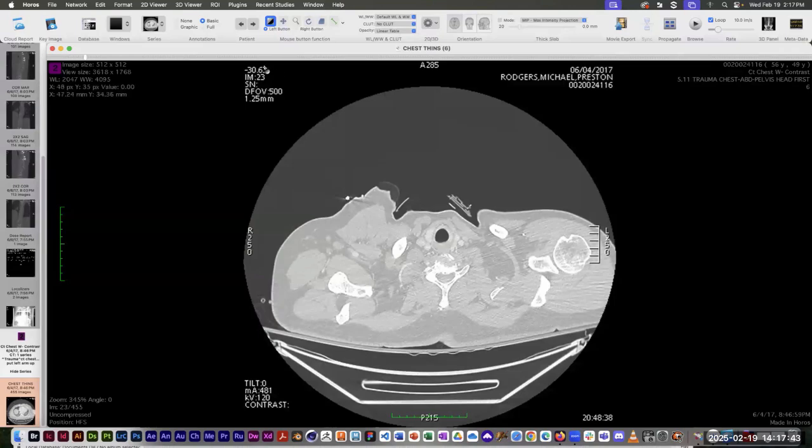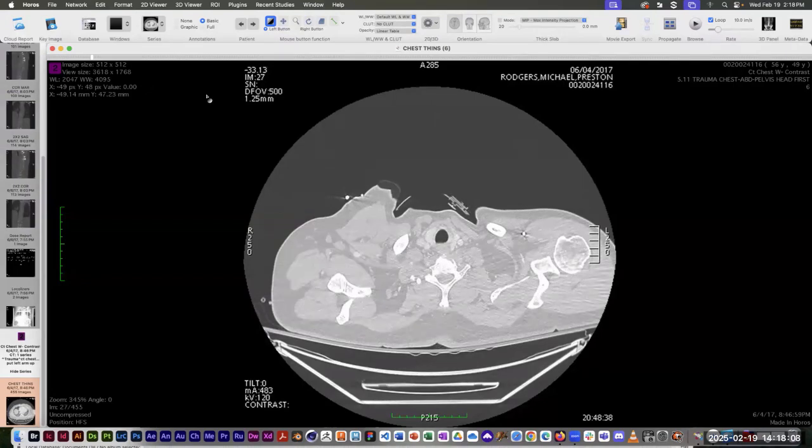So if you look here in the upper left corner of this particular image, you'll see there's a number up there, negative 30.63. And as I use my arrow keys and just cycle through these, the next one is negative 31.25, negative 31.88, negative 32.5, negative 33.13.